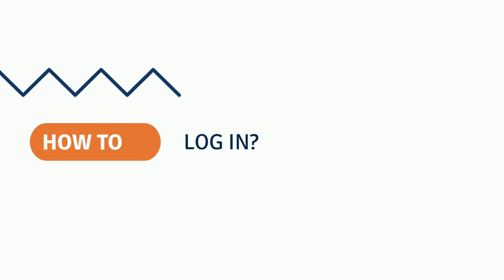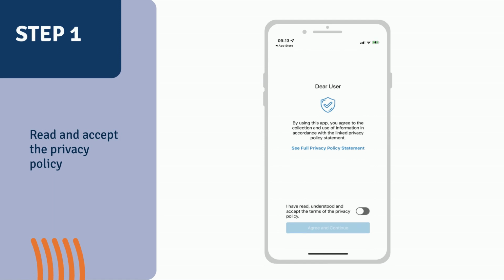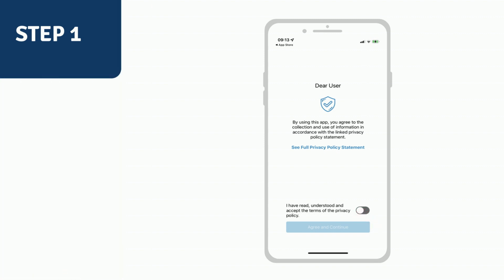The second part of the video will describe how to connect for the first time to Treatpath, your mobile care application. When you first log in, you will have access to the privacy policy statement. The application is secured and data is accessible by your healthcare team only. The protection of data is very important for Liverpool Heart and Chest, and we invite you to read the document carefully before giving your consent.